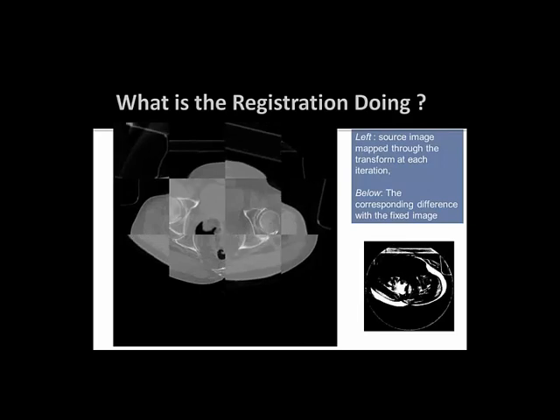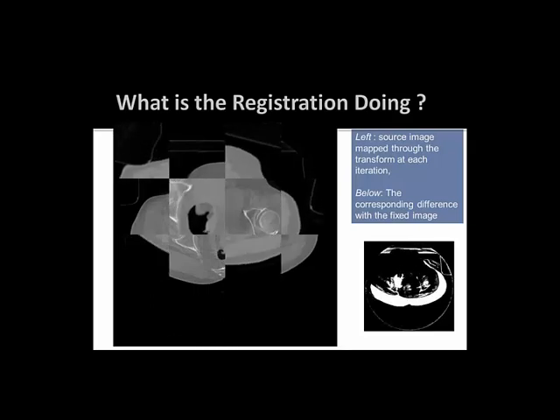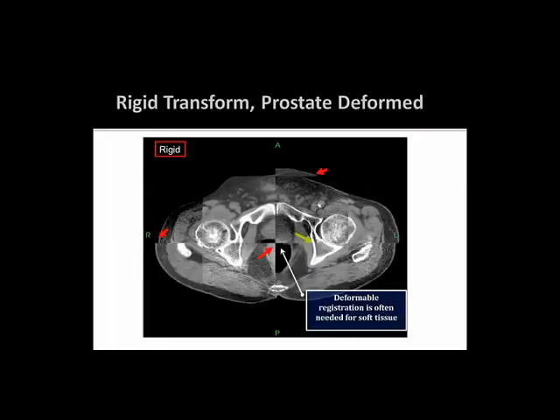So in a rigid registration, we can see where the green arrow is pointing, there was a good matchup of that bony anatomy, but there are a couple areas where the red is pointing to that a rigid really can't get completely aligned. And it kind of makes sense that it's the soft tissue. So this patient's body outline, and also where the rectum is, are where the changes are that we don't have a perfect matching. So we really need to use Deformable for that soft tissue.